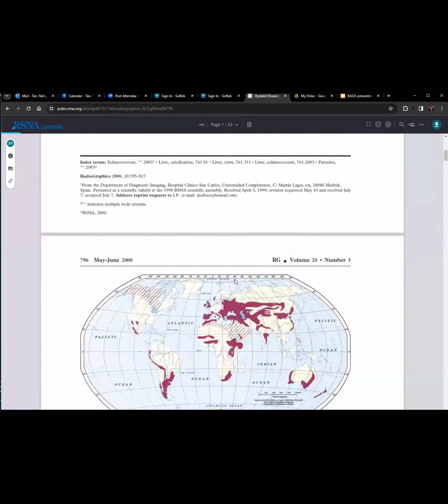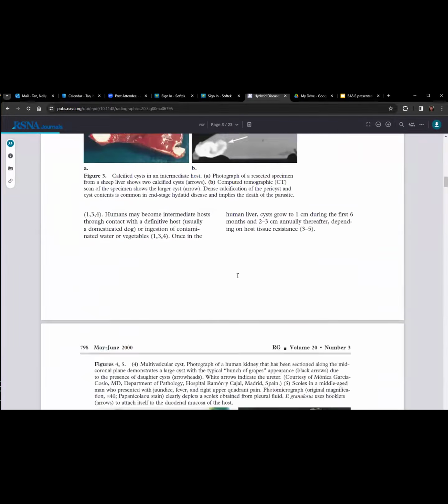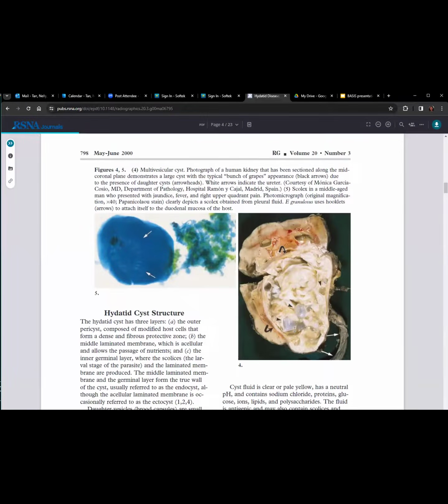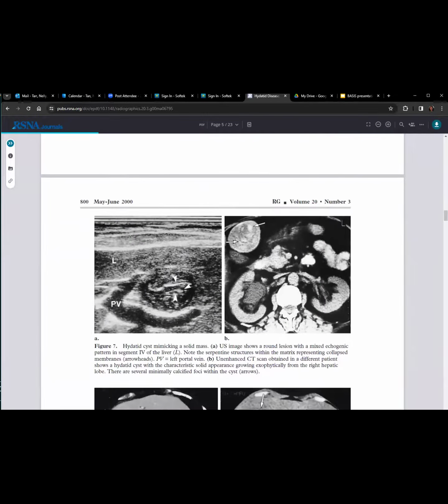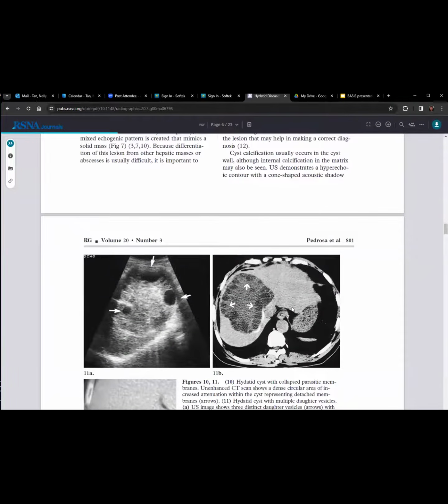So this is all echinococcal disease, and let me scroll down to some of the relevant imaging findings. Pathologists look at the hooklets, and they can also look for the laminated appearance. I'll show you some of the manifestations we saw on MR. The small cystic ones were hard, because I was wondering, is it an MCN? Is it an IPMN? When you start to see the larger daughter cysts like this, you feel more confident. But the first 2 cases were really small cystic masses in the liver.